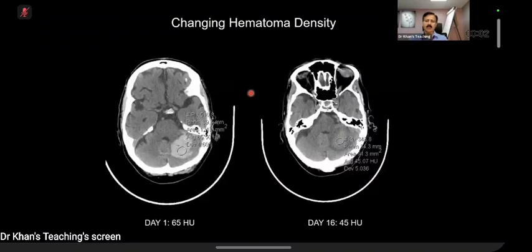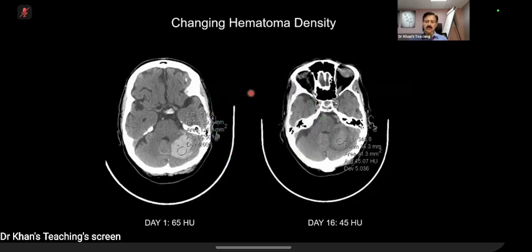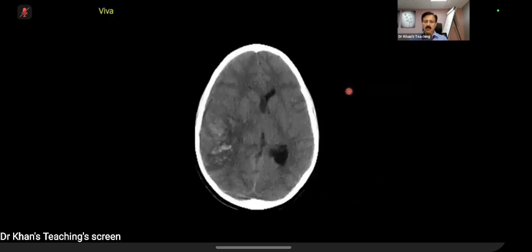Further into it. I'm not going to teach you hemorrhage on MR because we have done it. And in the trauma world, usually it is CT, except for diffuse axonal injury, in which you might like to use SWI sequence, and we will see a few cases. Okay, my question is a lead question. How will you tackle this? How will you describe it? Can I hear your description, please?